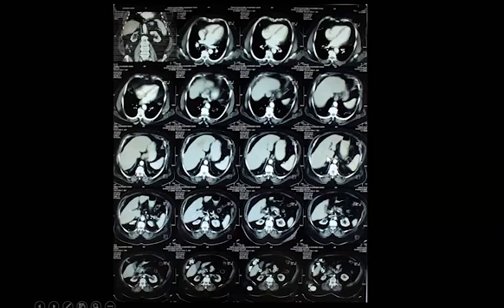Maybe there's a bulge. Why is the suggestion that there is ascites? Because the radio-opacity that's there hides everything. Exactly. He thinks there is a bit of opacification of the abdomen that may suggest the presence of fluid inside the abdomen. It could be that, or it could be that the X-ray is too soft.